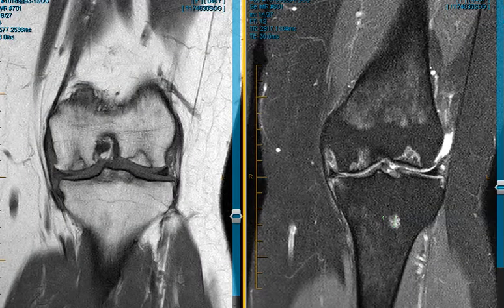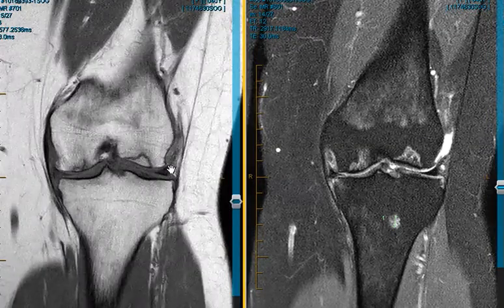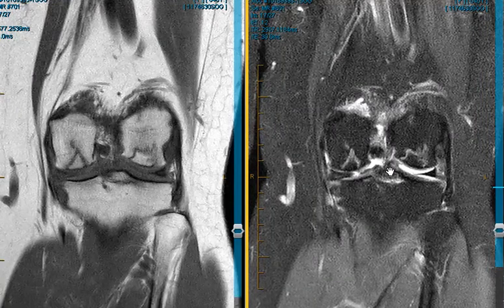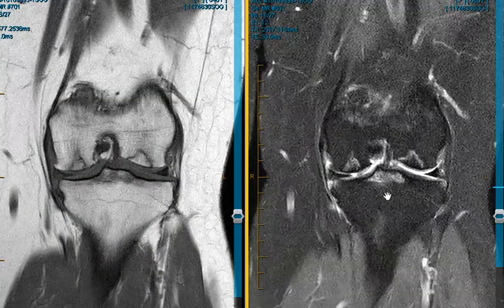And this patient, we don't know why she has AVN, but patients with AVN can get that from prior injury where they have a fracture and injury to the blood vessels. People who have long-term steroid use or long-term alcohol abuse or sickle cell disease, or other blood disorders. Patients with chemotherapy or radiation therapy where there's injury of the blood vessels can get it as well. People with pancreatitis are more prone to get avascular necrosis and several other things. But this is a patient with avascular necrosis of the left knee here.